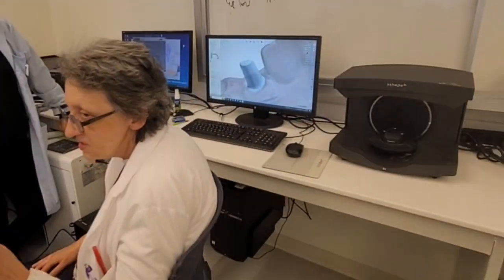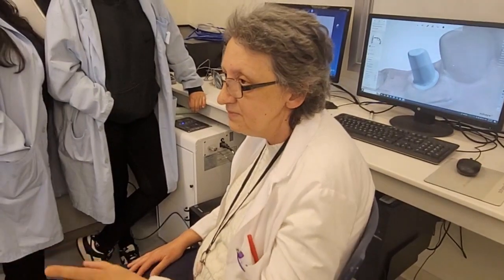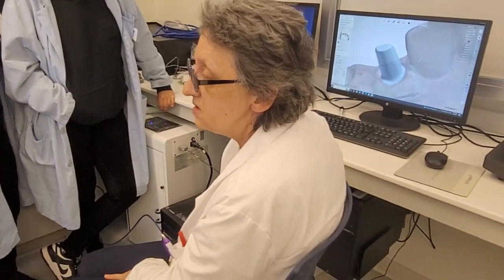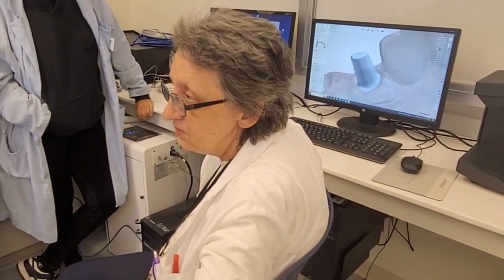So everybody has access to those computers. Okay? You don't have to scan it in, or delete the scan. No, let's rescan, that's it. That's why I came here, to show you the scanning and setting up the order. The order is already set up in the computer.